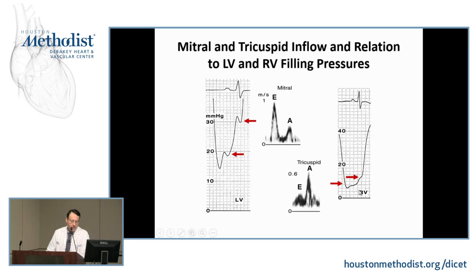If you look at the RV diastolic pressures, the pre-A is about 8, the EDP is about 12, and it's a low E, high A. So if I'm looking at this diseased heart and I'm looking at this difference, why do they look different? The odds are high they look different because LAP is up, but RAP is normal. You can have other things that point you in the same direction with respect to the LAP as well as the RAP.